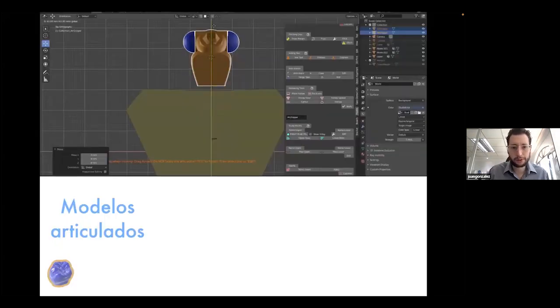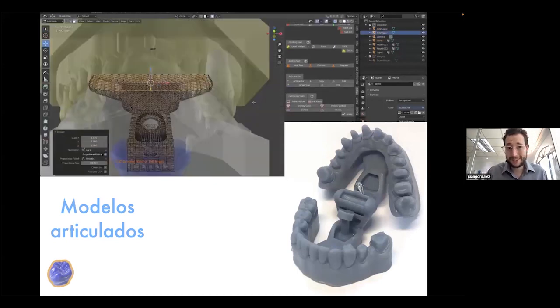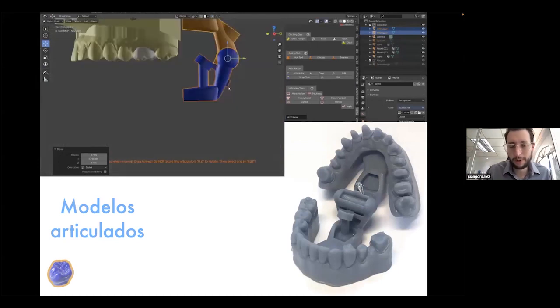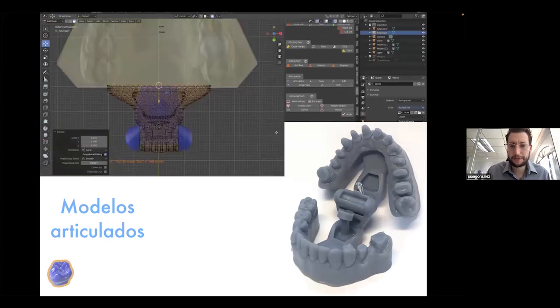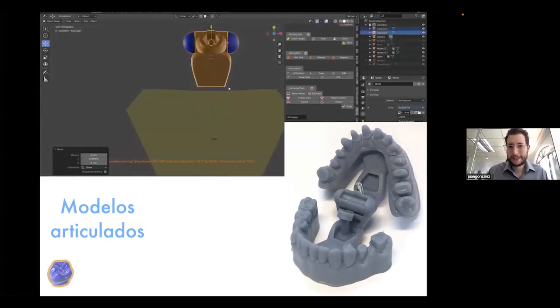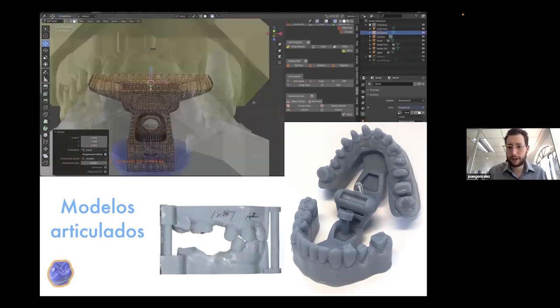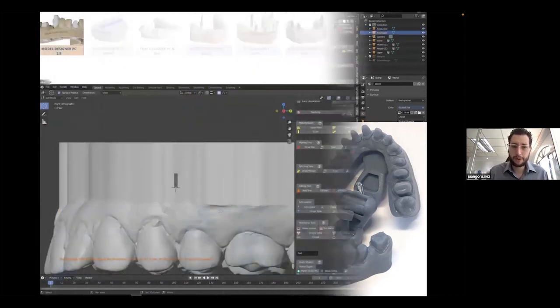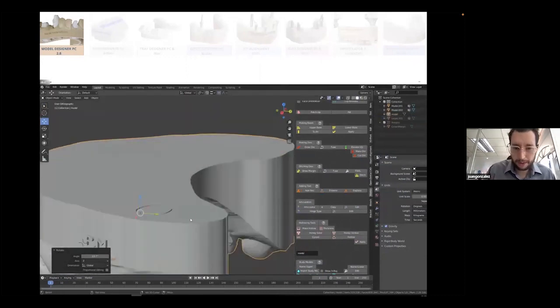All right. And also you can use a small articulator, which is included in this module. This, as I said, is a mandatory module because it has all the information necessary to work with all other modules in Blender for Dental. And it has a retail price, I think, of $79 for three computers. So I think it's an impressive software for a very low price. All right, so you have different options to have those small articulators to 3D print. And of course, you can put labels in here and have your models with a patient name, etc.